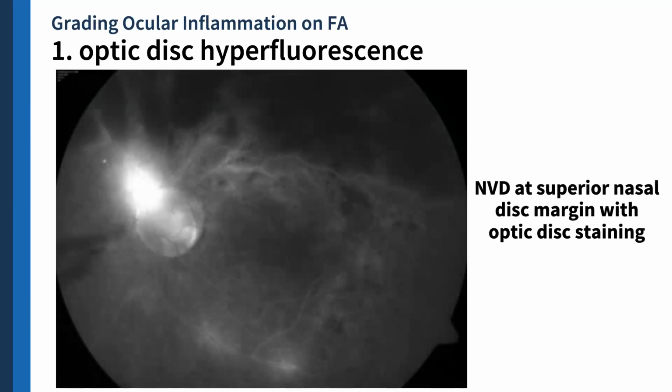Okay, so yung neovascularization at the disc, so as I'm sure you guys have seen FAs of patients with diabetes na there's early focal hyperfluorescence in the very, very early films. So pag ganyan, so that's NVD. It's not really an optic disc inflammation. Okay, so that's different yung dalawang yun.